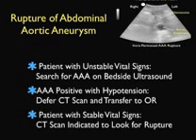However, in a patient with stable vital signs in which a AAA is seen, a CAT scan is indicated to look closer at that retroperitoneal area for rupture of an abdominal aortic aneurysm.